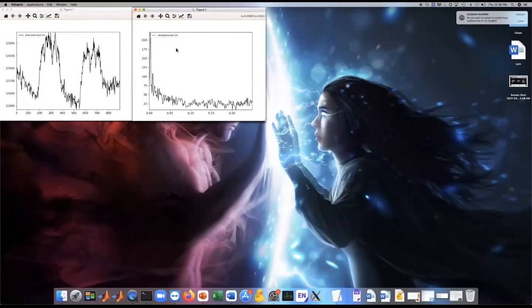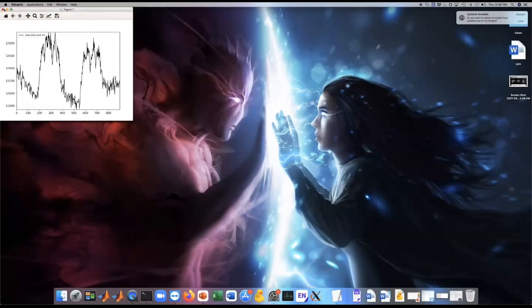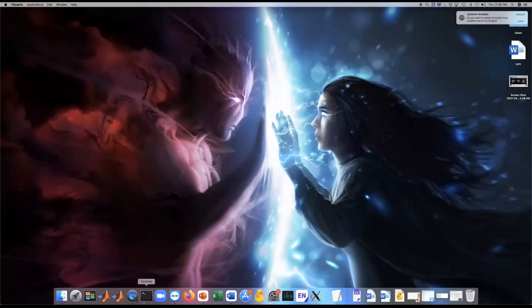We can zoom in, and we can see where the peak frequency is located in the data. And here it is at somewhere between 0.002 and 0.003, or around the 1 divided by 360 second cycle, which we calculated before from the stimulus paradigm.